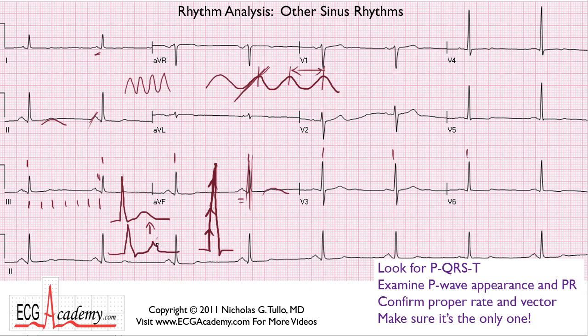A little bump, or a sharp spike, or sometimes the T wave will look like it has a bite taken out of it. That high frequency, sharp, spiky part of the signal very well may be a P wave buried in there. So I always like to say, when I see heart rates below 50, could there be another P wave hidden in there?